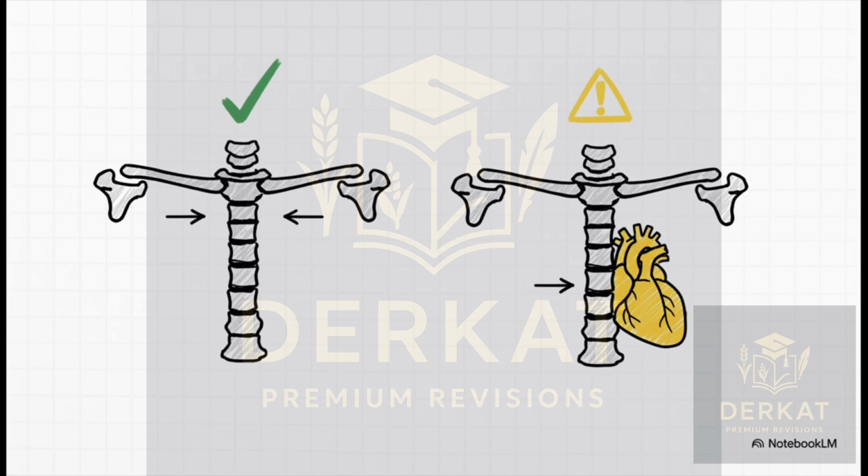You want to look at the medial ends of the clavicles. You know, those little bony knobs right at the front? They should be the exact same distance from the spinous processes of the spine. If they're not, it means the patient was rotated when the image was taken, and that can make the heart look artificially bigger or smaller. It can even make one lung look wider than the other, which could trick you into thinking there's a pathology.